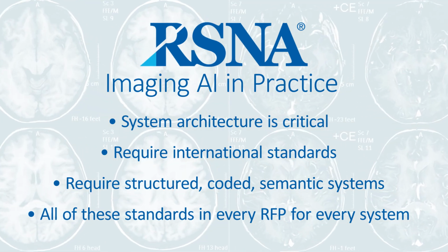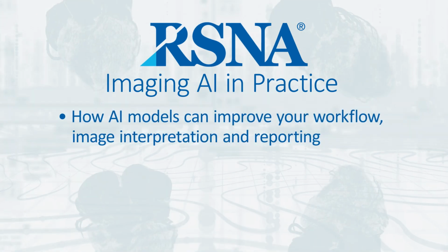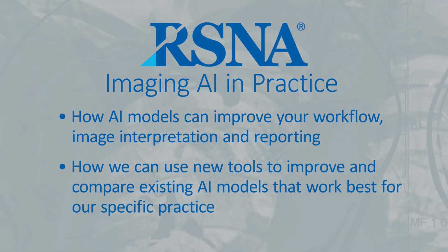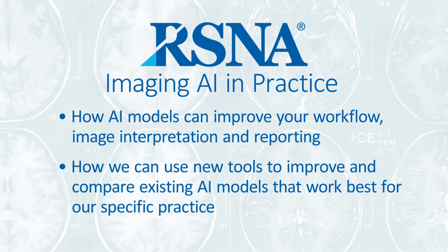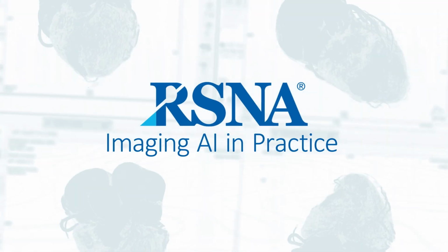Benefits shown in this demo include how AI models can improve your workflow, image interpretation, and reporting, and also how we can use new tools to improve and compare existing models that work best for our specific practice. Thank you for your time. Please review the other two demonstrations as part of this series.